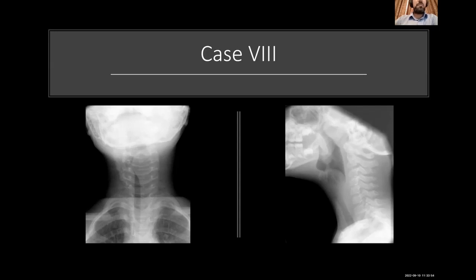So in this case it is a cyst, could be hemangioma. It is difficult to call it only a cyst; you have to mention the other differentials. The hemangioma is accepted, as this is at the level of the larynx. Is that clear? You have to mention the other differentials, but this is not croup. Croup should come from here and here, but here it is from one side. So for me, it is a laryngeal cyst and hemangioma.